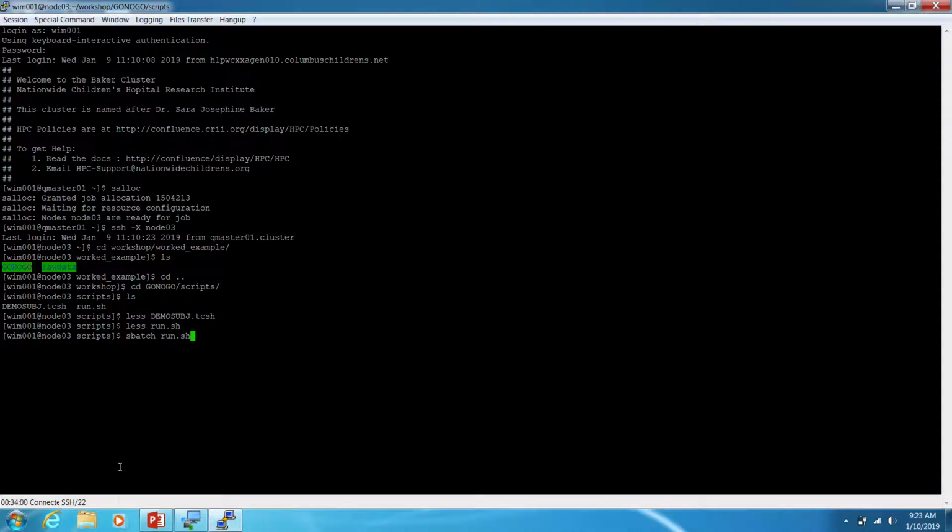If I push enter here, it would start the script, and then 3 or 4 hours later, it would send you an email saying, hey, the job's done. Since I don't want to spend 4 hours waiting, I set things up so that we could look at an example that was already set up.